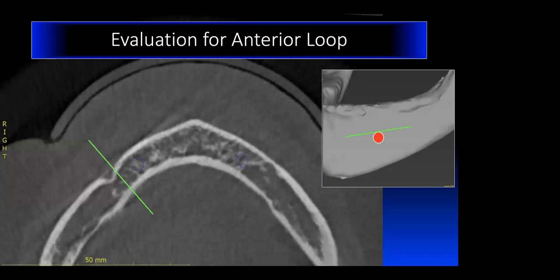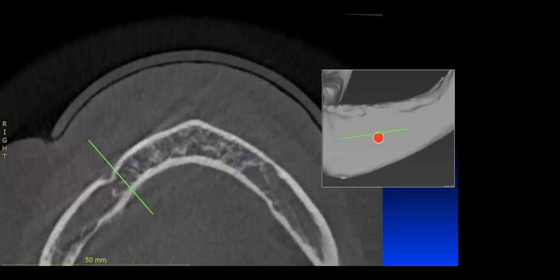And all I'm going to do is click 1 millimeter inferior at a time. So here is the first millimeter. So now you can see the nerve, which is highlighted in pink there. So the mental foramen nerve component is highlighted, and the inferior alveolar body, because it's in different planes, you're not seeing all of it in one plane.